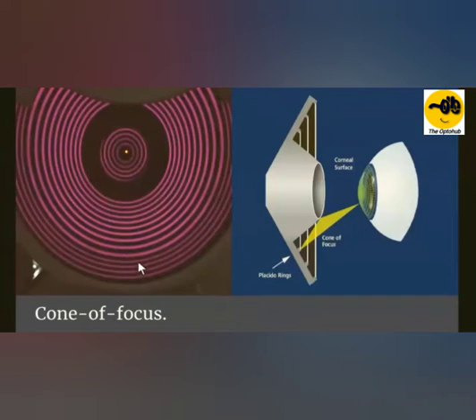Instead, if you can see over here on the edge, they have designed it in such a way that a very small diameter of the dome is enough to shine the light on the cornea and provide enough Placido discs, or enough of an image, on the cornea, which also helps to reduce data loss and so on. So this is a patented technology.